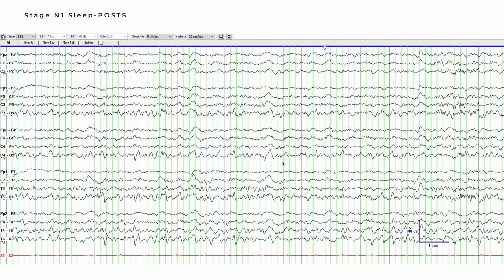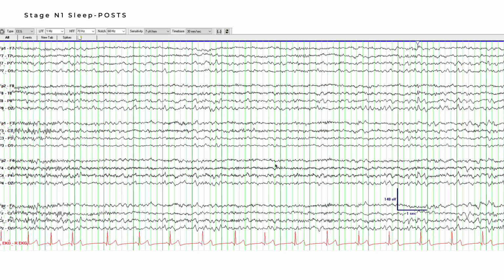This is a good example of what they look like. Epileptiform discharge, which we'll cover later, but just remember this is positive. And this is a feature you'll see on most EEGs you're looking at. Here's a bit more of a subtle example, but you still see them.